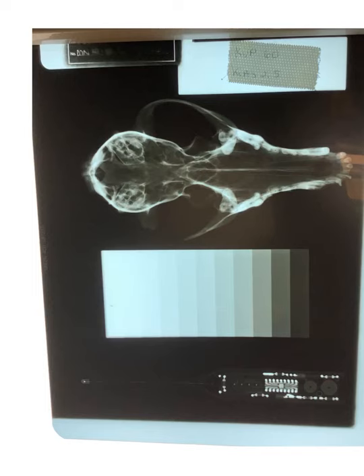Now, with this x-ray here, we've moved up to our kVp of 60. So we've increased our force. Remember, MAS is the same exact number of x-rays hit this as they did previously. We just used more force. So here we have this exact same step wedge. And if we look at this one, we can count quite a few steps, right? 1, 2, 3, 4, 5, 6, 7, 8, 9. So I can count at least 9 steps before they sort of wash out into a sea of white.